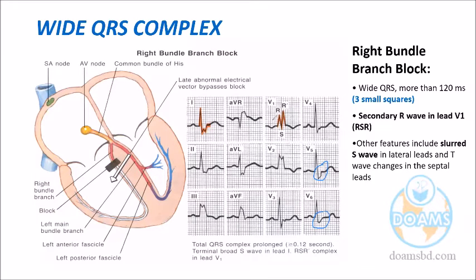So in V1, the QRS is wide. So S also wide, rather to say. So another common term is slurring. Slurring is also important for the block. Okay. We are not hurried. Go slow. Okay.